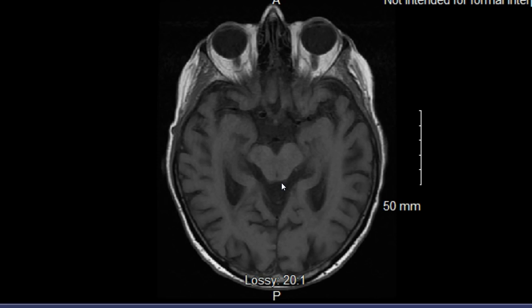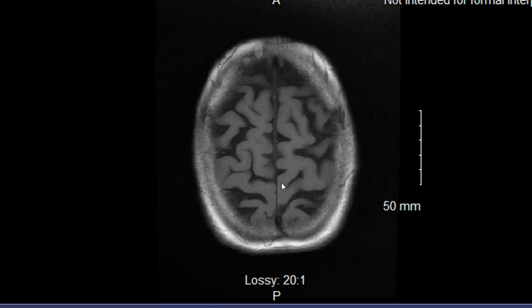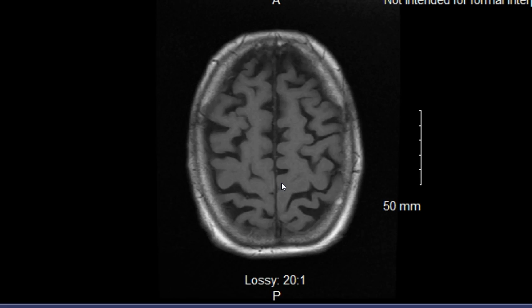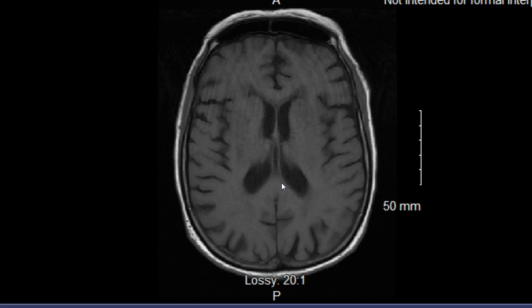So these concepts should not be theoretical any longer when you're learning this anatomy out of diagrams, or you're learning it out of an X-ray projection. And some of those things seem so very abstract because you're not able to visualize them well. That is definitely not the case when you're looking at CT and MRI because, regardless of the orientation, you can visualize so much really great information here.